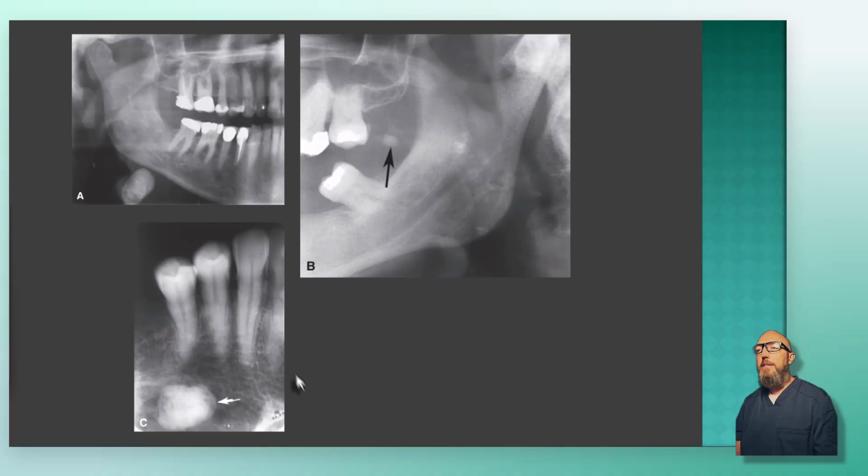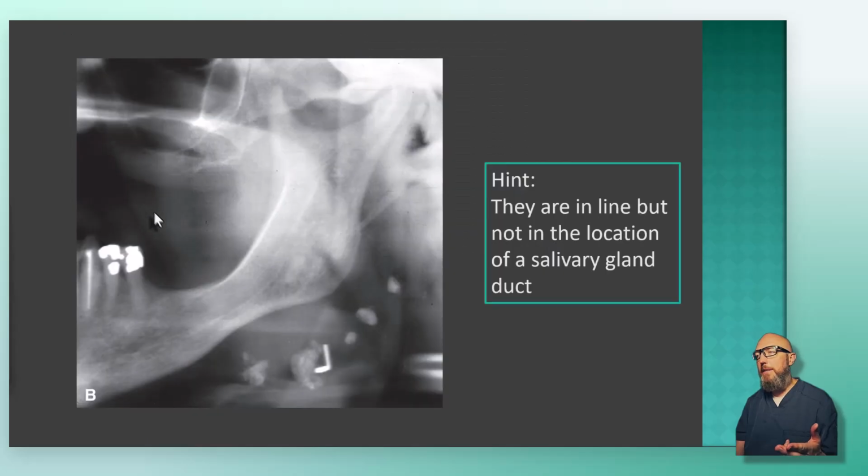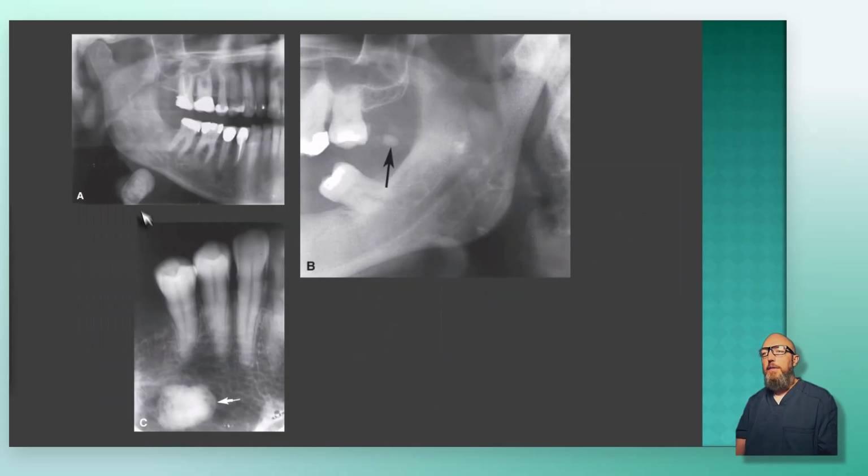All right, what about in these cases? Let's look at this one first. This is in the submandibular region, just below the body of the mandible in the posterior. And so you should think primarily two things: sialolith or lymph node calcification. Let's go back to this one. See how these were more cauliflower shaped, a little more irregular? And then this one is more smooth, well-defined, a little bit layered, almost like our Shrek, but it's not osteomyelitis. This is our typical sialolith.